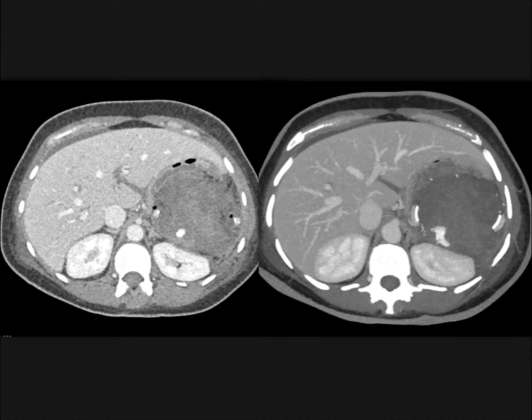And what you see in the axial, which was from the earlier phase, you see a bleed in the left upper quadrant. Now, you can see bleeds or just some hemorrhage or some fluid post-distal pancreatectomy and splenectomy, but this is a lot of blood. And then you look carefully, just in front of the kidney, there's a very high-density structure, about 1 centimeter in cross-sectional size, and that high-density structure expands in its size as you go from the arterial to the venous phase imaging, and that was an active bleed. That was a bleed from the splenic artery.